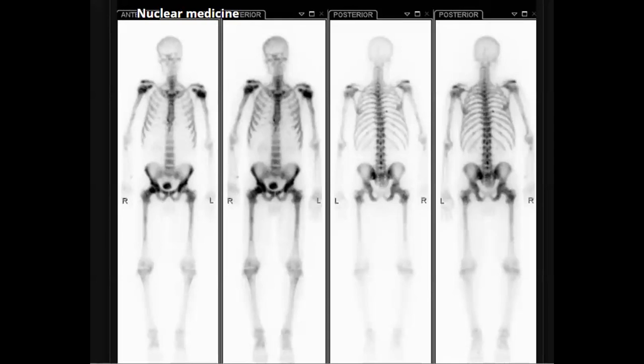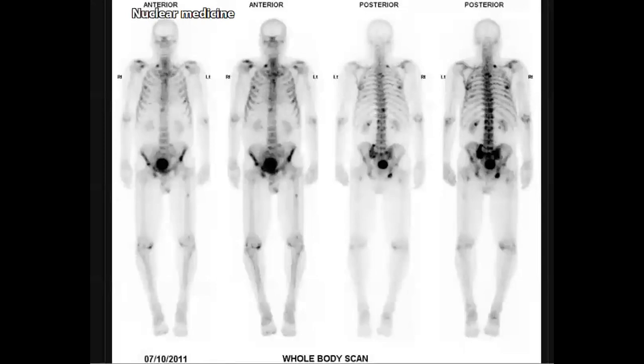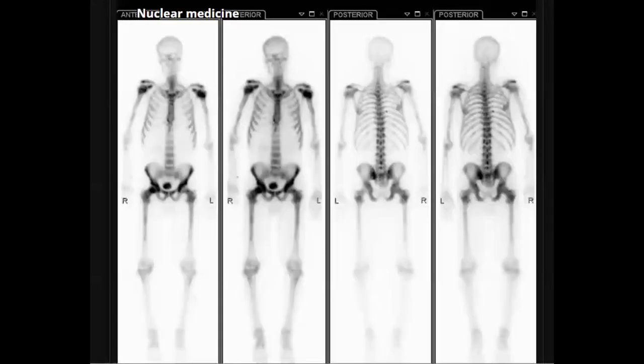We mentioned something very important. Yes, Ruba. Excellent. We mentioned that you have to check first the renal uptake and soft tissue uptake. You remember this rule? So go back. Yeah, it was here, and there were many metastases. But right now, what do we have? Yes, we have a super scan.